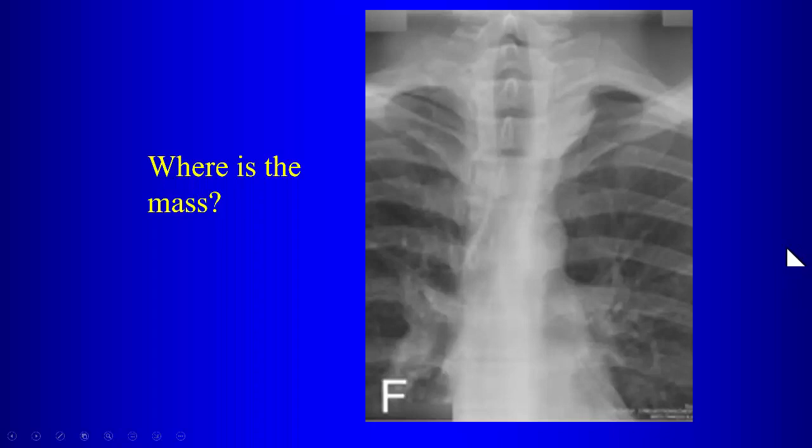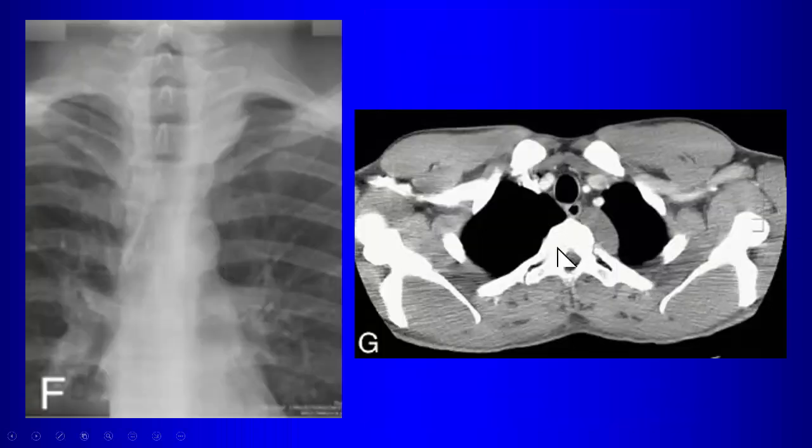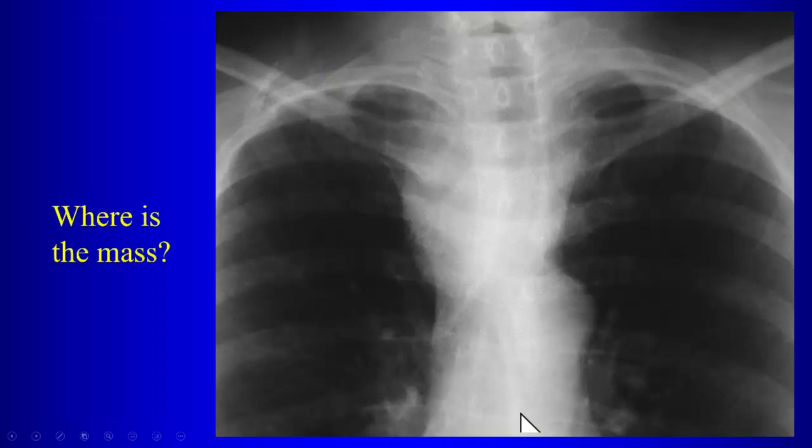What do we call the cervicothoracic sign, right? If we can see the lateral border clearly above the clavicle, it means that the mass is interfacing with lung tissue, that there's air out here, so it must be a posterior structure. So this has to be posteriorly located in the posterior mediastinum, and if we're dealing with posterior mediastinal masses, we start our differential with neurogenic lesions, right. This was a neurofibroma, okay? So that's a posterior mediastinal mass.